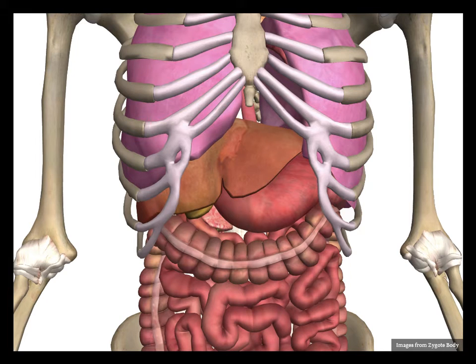Recall that the gallbladder is a non-fixed organ that sits tucked under the edge of the liver in the right upper quadrant. On one hand, this is fortunate for biliary imaging as the liver is a great acoustic window. But on the other hand, the ribs, which are of high impedance and cast shadows, can sometimes obscure the organ.